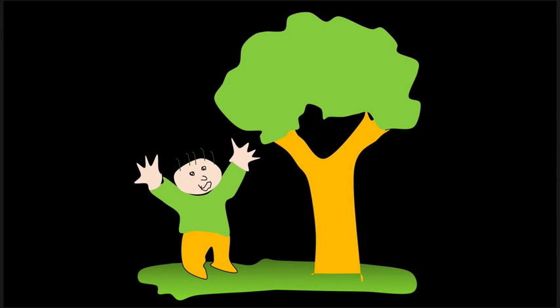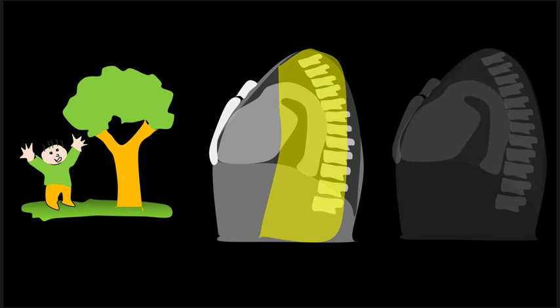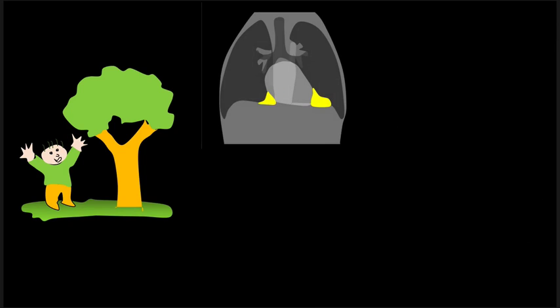So as a quick review, not everything that looks the same is the same. On a lateral view, sometimes the arm or the scapula can increase the density, make you think that there's something going on. It's important to look out for that. There is, in some people, a little bit of increased density there at the anterior portion of the heart. It can have a variety of different shapes, but the more of these you look at, the more you'll start to recognize that thing as not being a big deal. On the frontal view, a large amount of fat around the heart can blur the diaphragm or the heart border on either side.